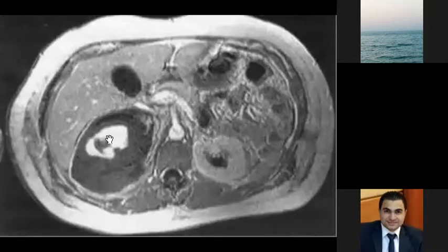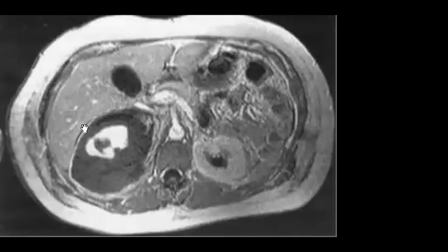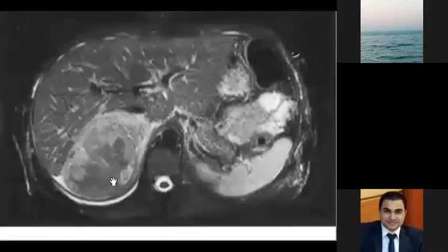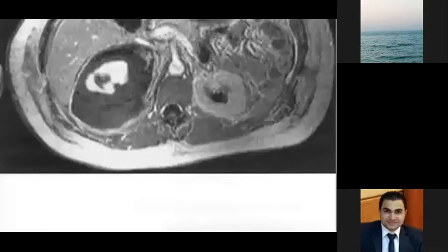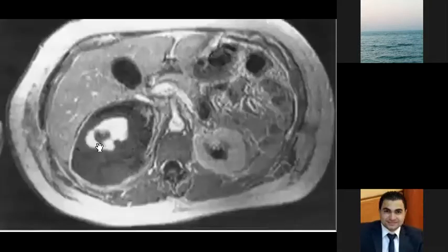Yes? Carol, can you suggest something? Suzanne, okay. So this area could be hemorrhage or fat. So you need what is called fat suppression. If you find this fat suppression now, what do you suggest? Is it fat or hemorrhage? So it's not suppressed. This means that it is hemorrhage. Nice. So when you find this area with hemorrhage, now try to collect the findings.